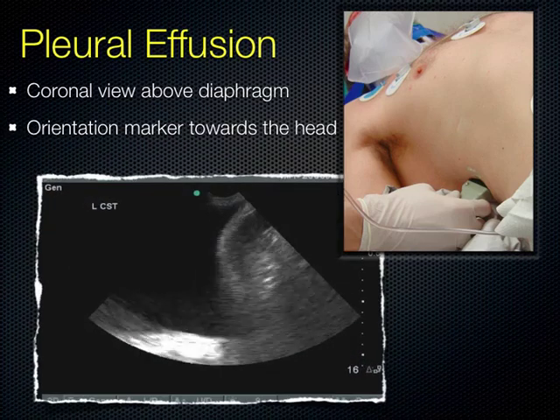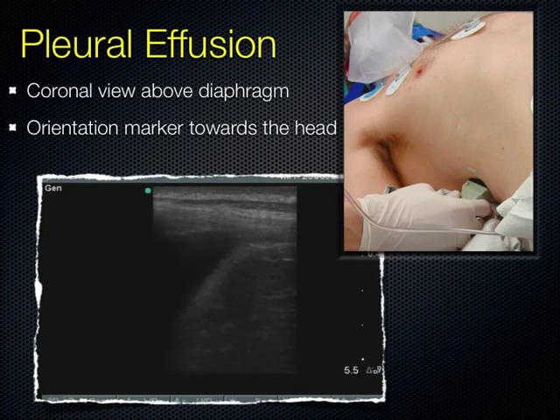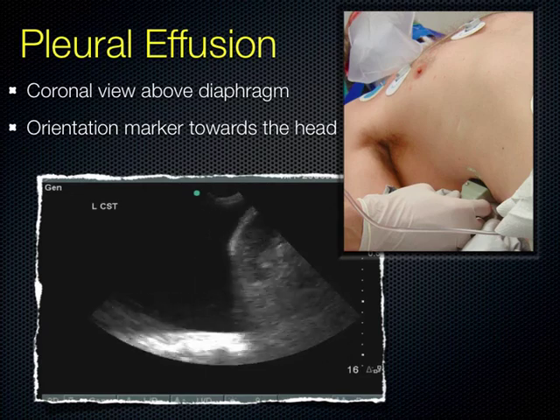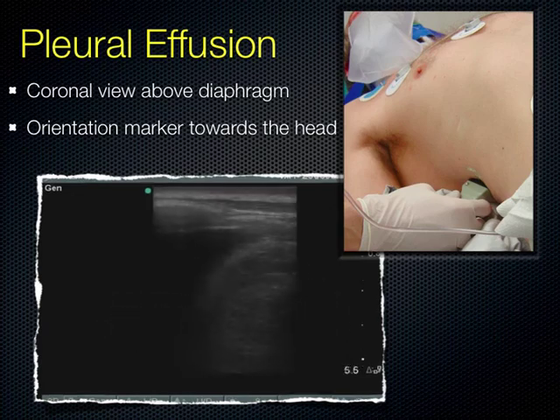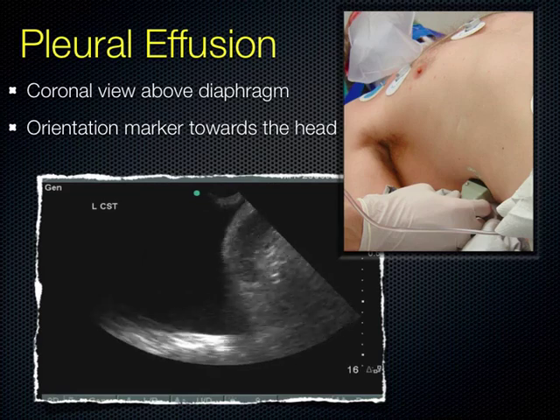blackness, what is black? What turns out black in ultrasound? Fluid. Right. What does air look like in ultrasound? Air doesn't look white. Air, you can't see air. Air just scatters the picture, right? Air doesn't conduct ultrasound well. So basically, if you have air, I'll show you what happens when you have air in just a moment, you get a different kind of picture.